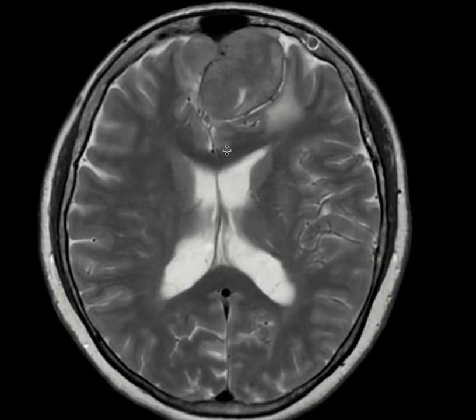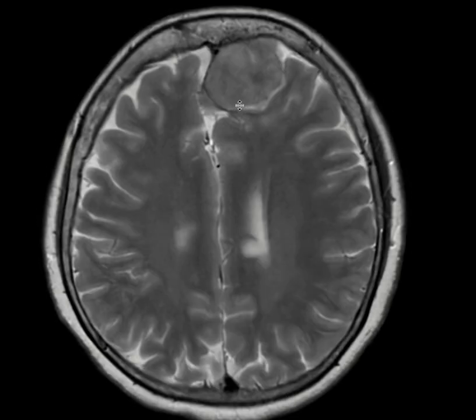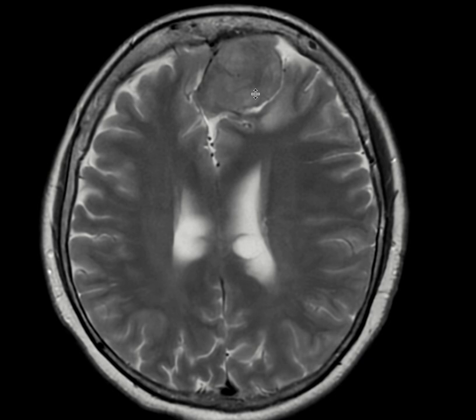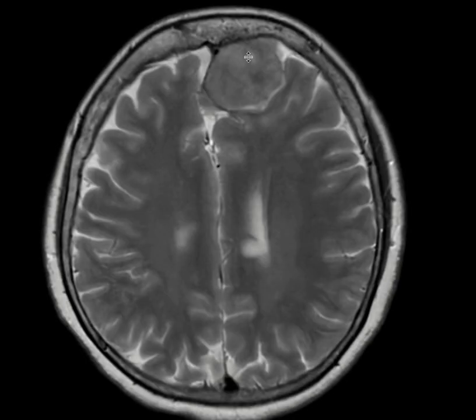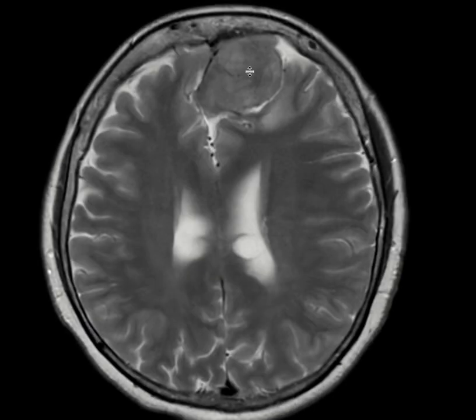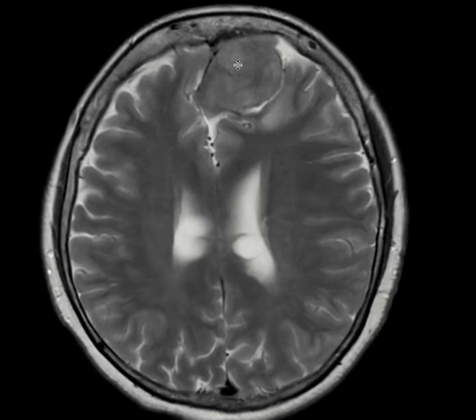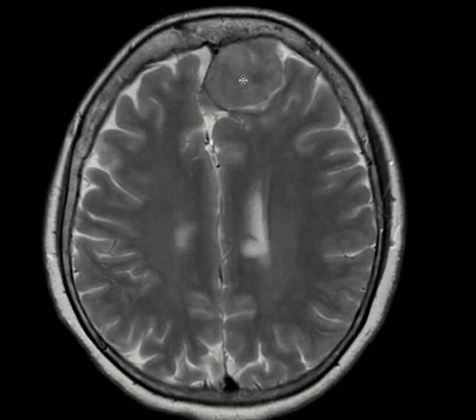And the other thing is, if you have a CT, sometimes in very extreme cases we have bony changes in the adjacent calvarium. For instance, in cases of meningioma, you usually get hyperostosis in the bony calvarium adjacent to it. Here I don't see that much in the bone. Specifically on MRI, it's really difficult unless it's very severe. So look at the bony structure to see what this lesion does to the underlying skull. Is it lytic, or is it sclerotic? That just gives you more information to make a differential.